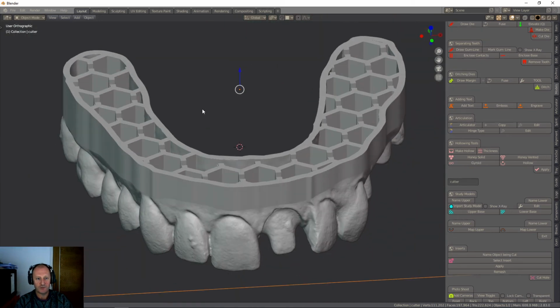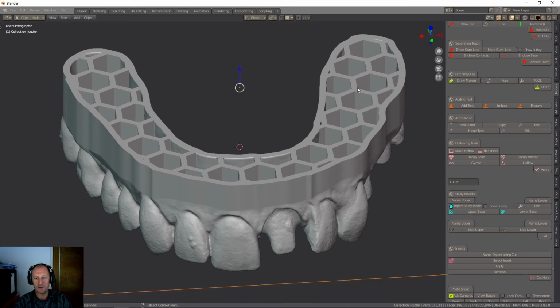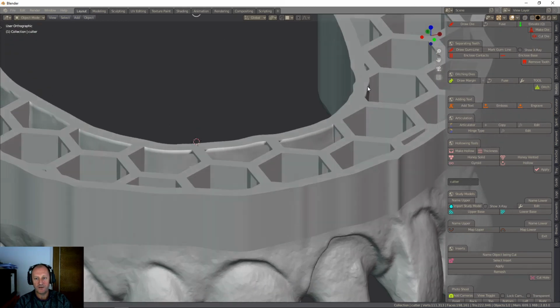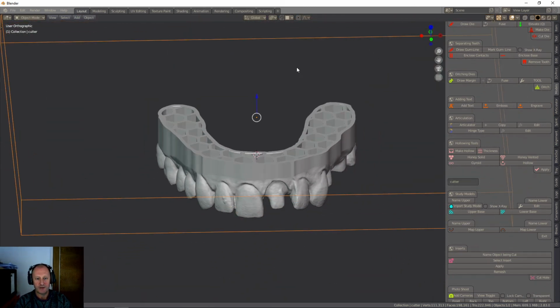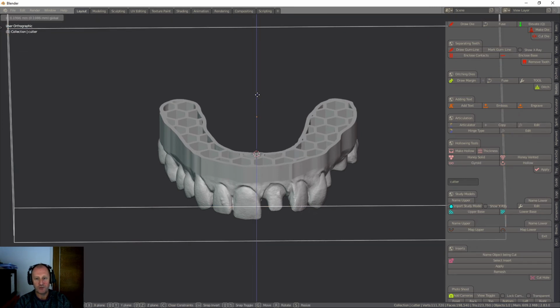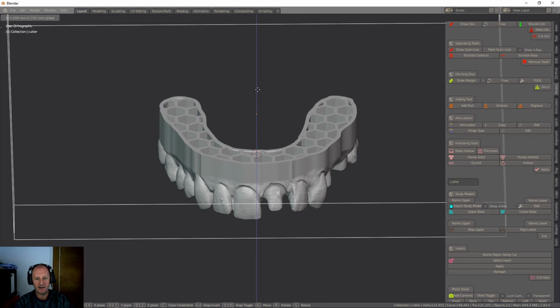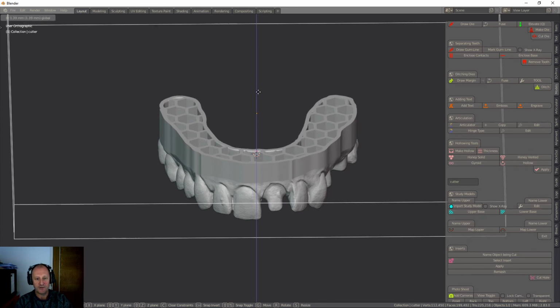We had a few issues with printing on the printer that we used with these voids. We didn't really know why we were getting problems with the printer until we realized that actually we were pulling that base down. There you can see it's now filled up. The voids are there. Now we can also move that up slightly more, make the base a bit thicker before, again, like the other one, it then closes over.